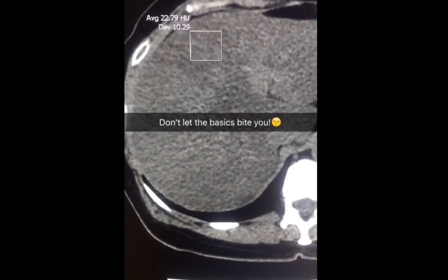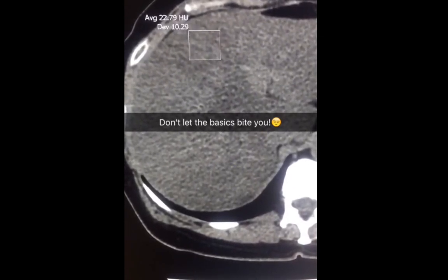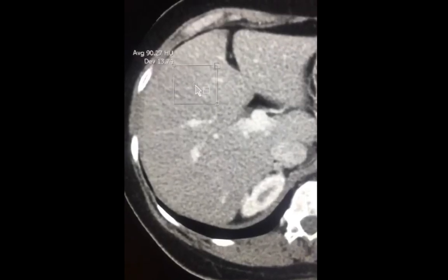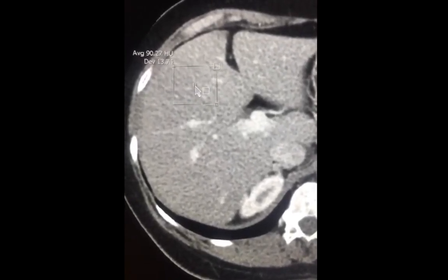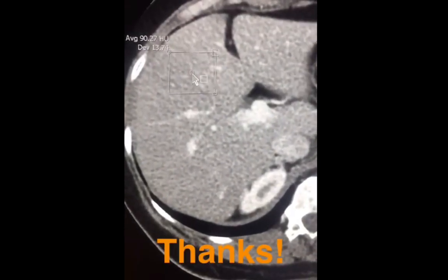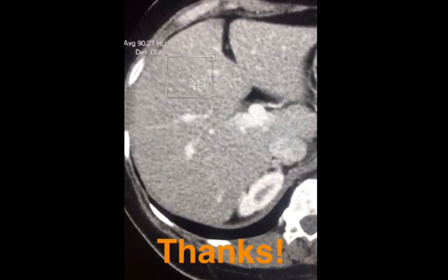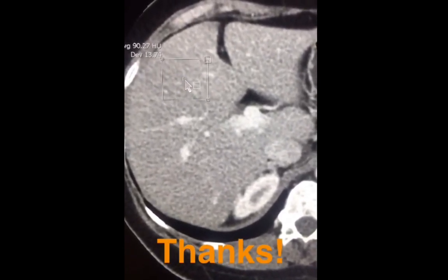Remember that forgetting the basics or not knowing them is the thing that could harm you most in the exam. Finally, this is the patient's CT a few months earlier before administration of chemotherapy showing normal hepatic attenuation. This is to remind us that chemotherapy could transform a normal liver into a fatty one.